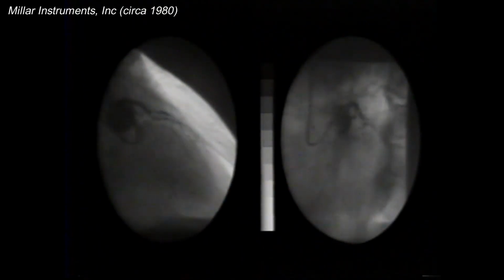Ill patients with fast heart rates could require an even higher frequency response to accurately reproduce all the components of irregular waveforms.